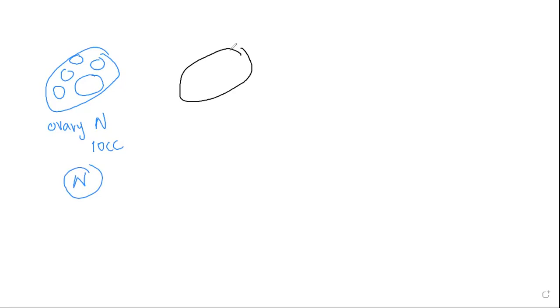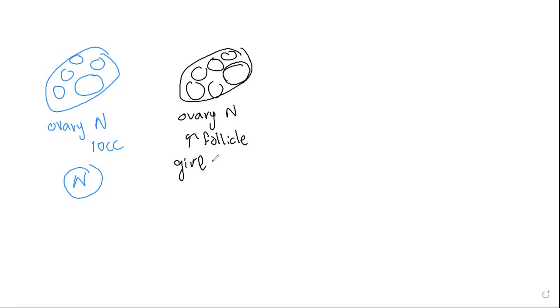All right. Another ovary here, but this one is having multiple follicles, but they are larger. Look at this. And one of them is particularly large. Again, the ovarian size is normal. So here the ovary is normal, but there are many follicles and they are large in size. And the female patient is a girl, around menarche, like 14 years and such. So this is a multifollicular ovary.